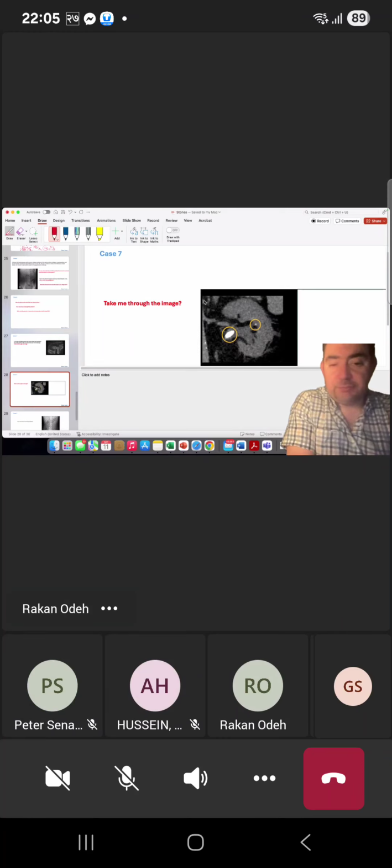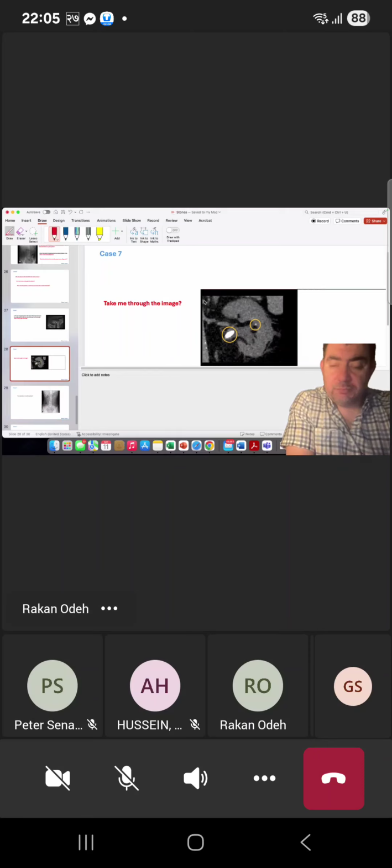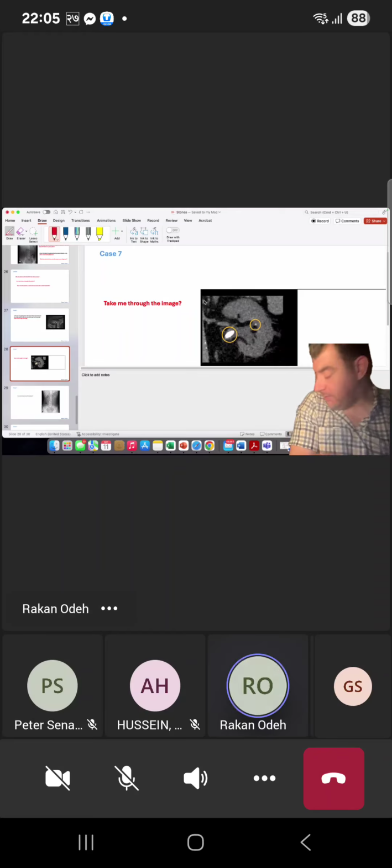So this is a CT scan without contrast of the left kidney, which is showing a renal pelvis stone. It looks like more than 1 centimeter, a large one, with dilated renal pelvis and a tiny calcification of the parenchyma in the interpolar region. I can't see the ureter or the other kidney or the bladder. Okay, it's time. Thanks.